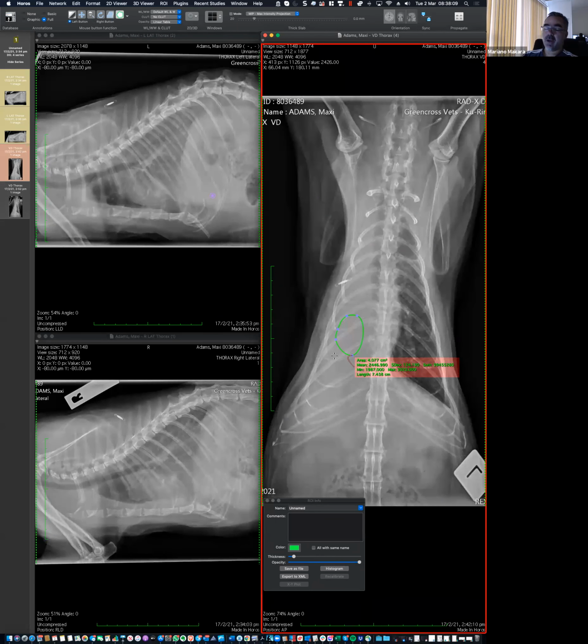And in my eyes, if you put this together with an older cat, this is a very common presentation of bronchogenic carcinoma in cats. So it's not the classic lung mass in dogs, where you have a well-defined mass, rounded like a football. That's in dogs, and that's a carcinoma that usually is not extending through the airway. Cats with bronchogenic carcinoma, it's bronchogenic. It grows along the airways and basically results in obstruction and bleeding within the airways.